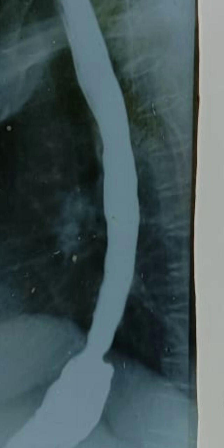Whatever is visible now is the luminal architecture of the esophagus, this tubular structure just in front of the vertebral column, and over here at the lowermost end we can see the diaphragm, and the food from the esophagus is ending up in a J-shaped organ called the stomach. So this radiograph, which is there to visualize the esophagus, is termed barium swallow, where barium sulfate paste is used as a contrast and the esophagus is visualized.